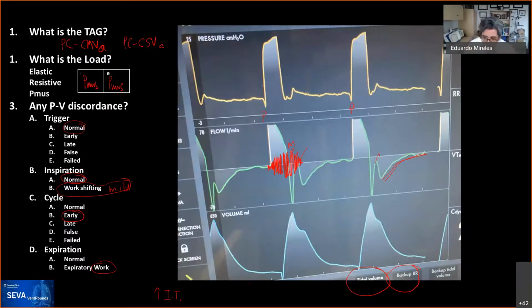Yeah, and Udi, this is a good question that you're putting. So remember that in adaptive, you're controlling in between. If the tidal volume is within target, in the next breath it would maintain the pressure at the same level as the prior one. So it's an in-between targeting scheme. So yeah, good points. Well, we'll leave that for another SEVA rounds because there are some abnormal behaviors with these types of algorithms, but we don't need to talk about that right now.